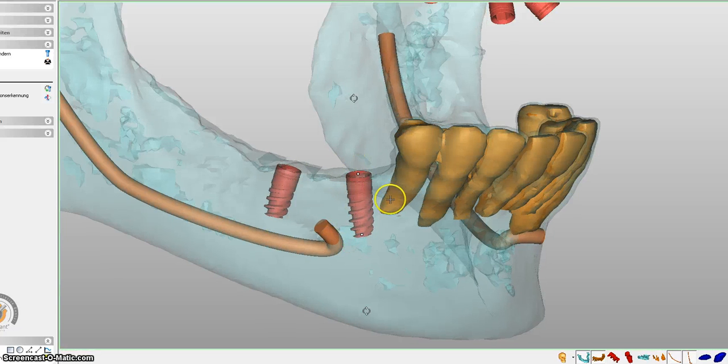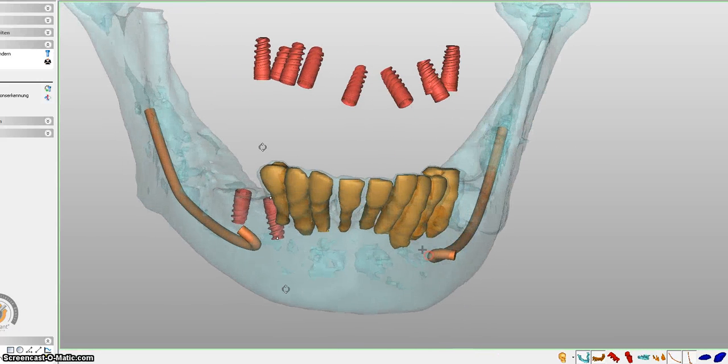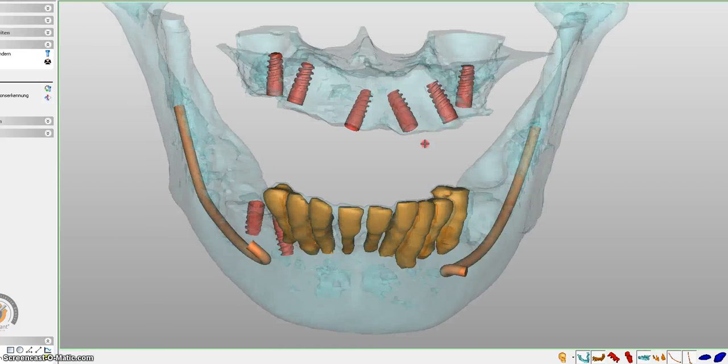After the implants have healed in, 2 to 4 months after placing the implants, you come back to us, we make some prints, and about a week later we have finished crowns that we can place on top of the implants, and we can place 2 teeth here towards the back so you could chew on this side again. So that's the plan for the lower jaw.